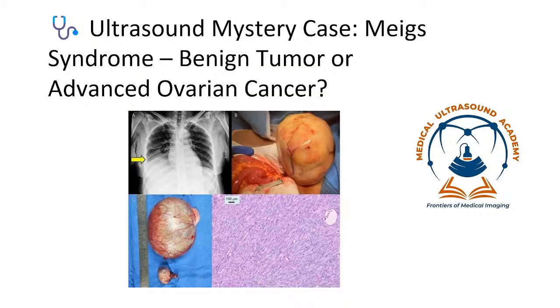Ultrasound mystery case. Meigs syndrome. Is it a benign tumor or advanced ovarian cancer? What's your take?